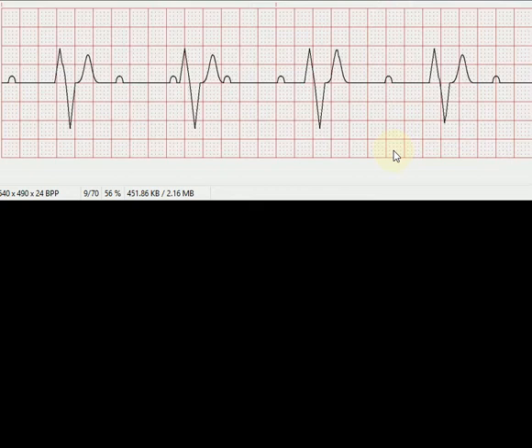How about PR interval? Is it consistent? Well, it doesn't take very long. I look at the first one, that's like, what, 13 blocks long? That's ridiculous. And then this one's like 2.5, and this one, oh, that's almost kind of normal. So it's an inconsistent PR interval. Well, yay, that's our 50-50 shot for the most part. With an inconsistent PR interval, we look at the R to R, see if it's regular or irregular to determine, do I have Wenckebach or third degree?